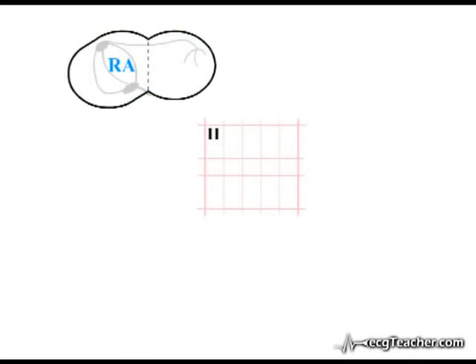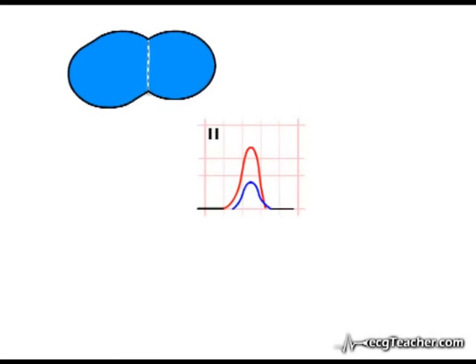Applying the rules we've used through this course, we would expect enlargement of the atrial chambers to produce predictable changes in the morphology of the P-wave. This is indeed the case, and criteria have been established for the ECG diagnosis of atrial enlargement. The right atrium enlarges downwards and towards the right. In right atrial enlargement, therefore, the magnitude of current spreading downwards from the SA node in the frontal plane is greatly increased. Consequently, the amplitude of the right atrial component of the P-wave increases dramatically in the inferior leads, illustrated here in lead 2.